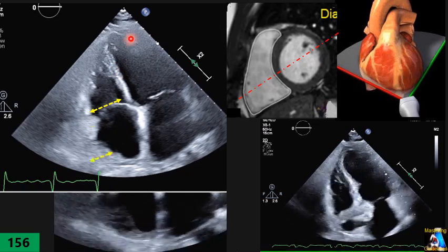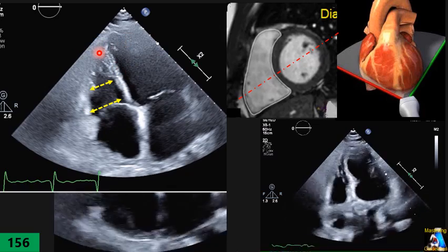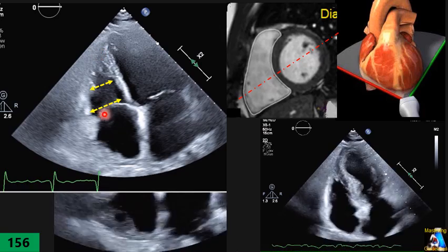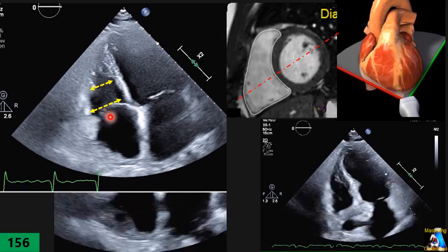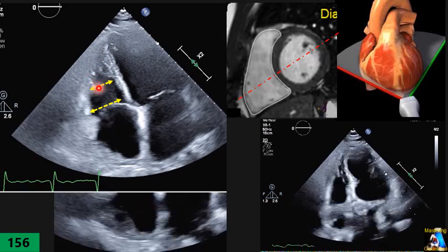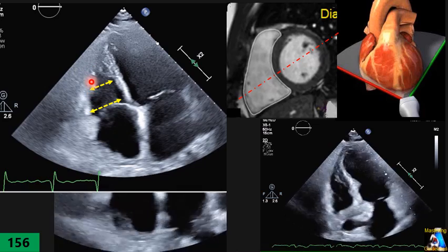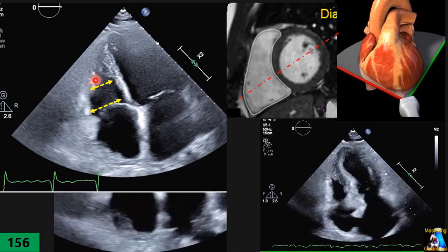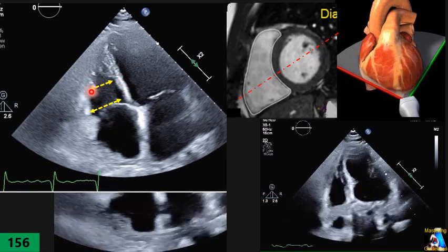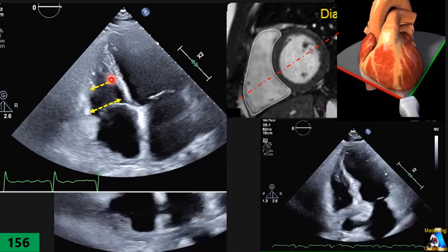The second one is the mid diameter. You go halfway between the tip of the right ventricle and the annulus, so almost here, from here to here and here to the apex is almost halfway, usually below the insertion of the lateral papillary muscle at this level, and make it without including the papillary muscle. Go endocardium to endocardium without including trabeculation.